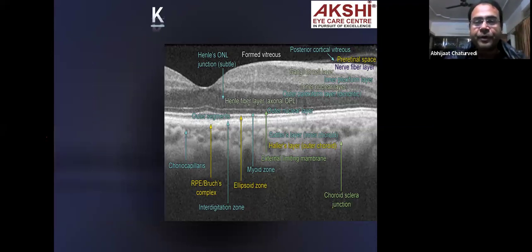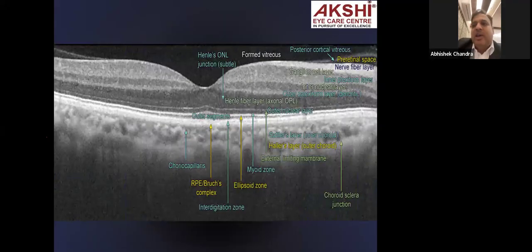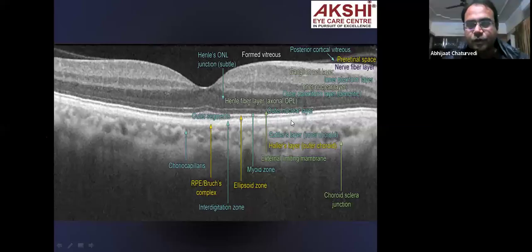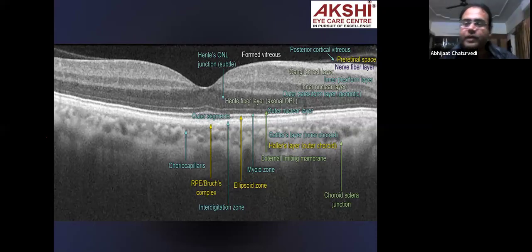Never do that. Abhijat, before we proceed further, can we have once more the layers in the last slide for the residents? Can you go one by one again for the help of the residents, so that we can go from Bruch's membrane towards the upper side? Okay, so what I follow is that I start from the inner part. We can start from the outer part also. Yeah, because while reading an OCT, we generally do that. So I follow that, and that's why I prefer that.